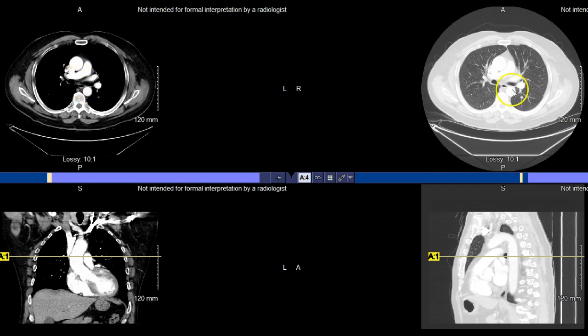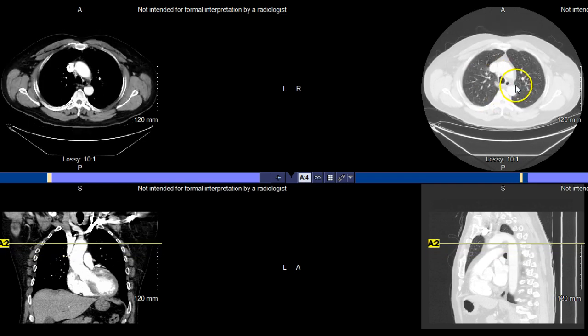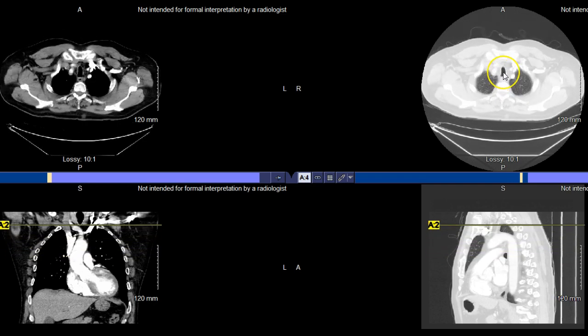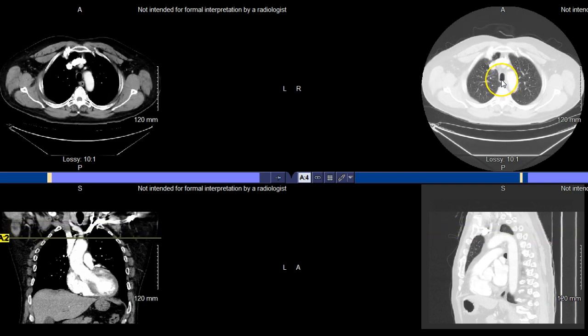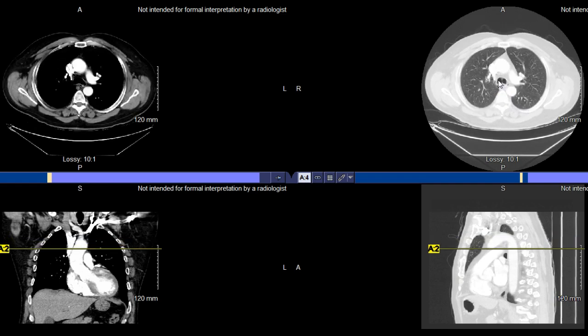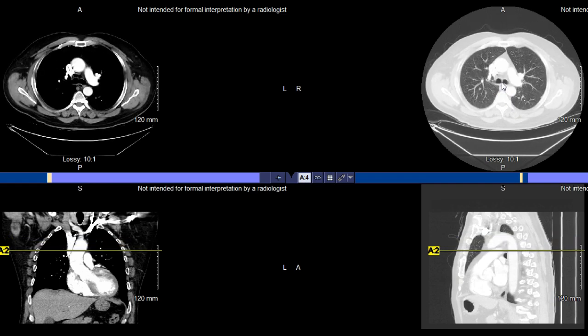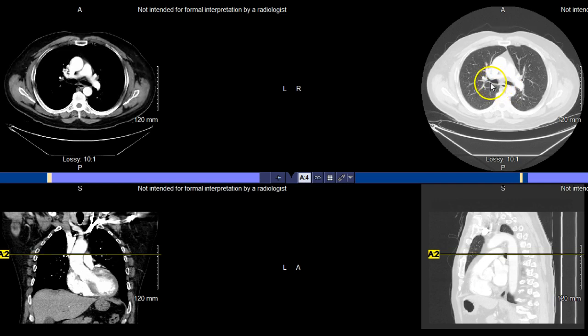So maybe a little bit easier though when we're looking at airway based structures to look over here on this data set. So let's just kind of focus on this one now, work ourselves down, and you can see definitely, all right, where is that bifurcation point out at the carina? Right there it is. It's nice and clear, so you can see those mainstem bronchi then, these dividing points. You can see again a little bit of air in the esophagus here, so that's what we're seeing back here posterior.